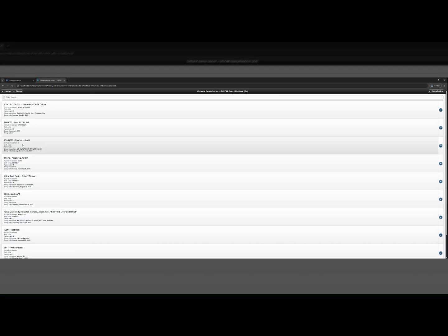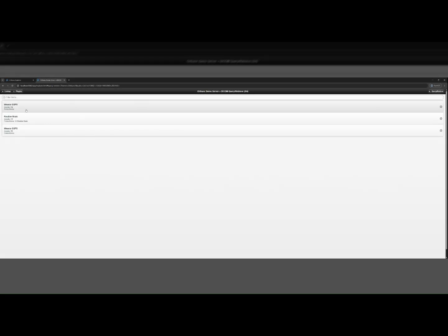Now, if I click on any one given study, then you would have different series that exist within a study. Again, that's that hierarchy that comes in. That's very important, right? Patient, study, series, image, or instance. And then what I would do is click on any given series, and that is what I would be able to retrieve back into my system.